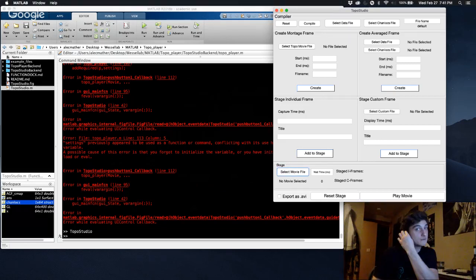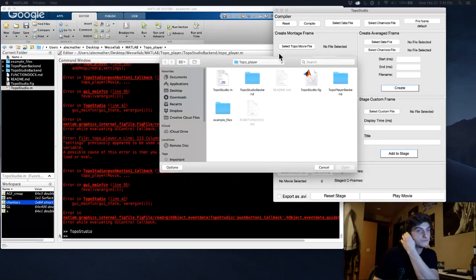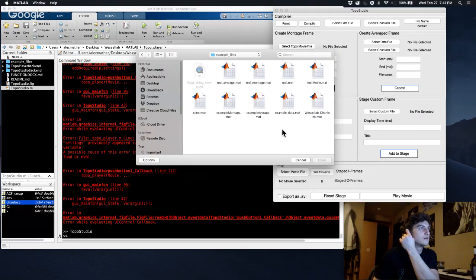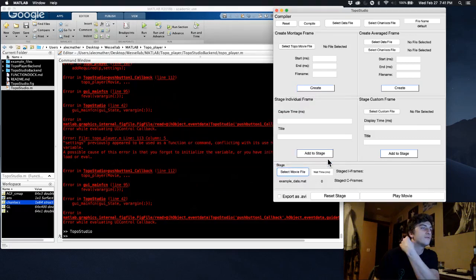Snag our movie file. I just changed how we get our sample rate because I wasn't collecting it the right way. It was right for a sample rate of 500 samples per second, but it didn't allow for any flexibility for people with a different sample rate.